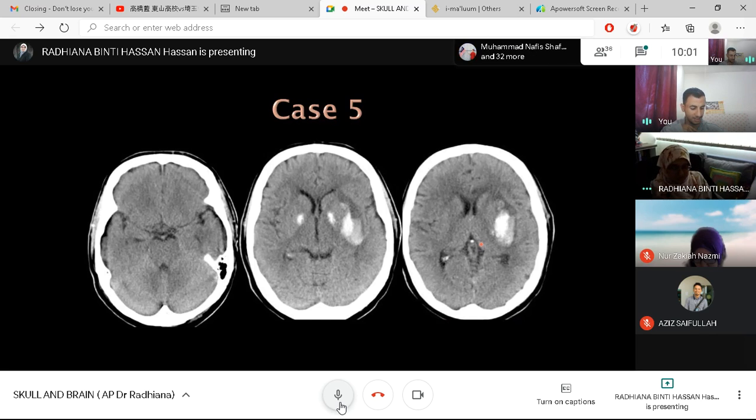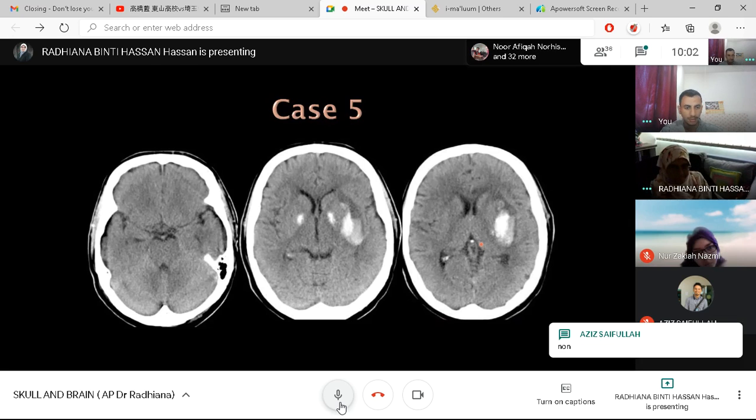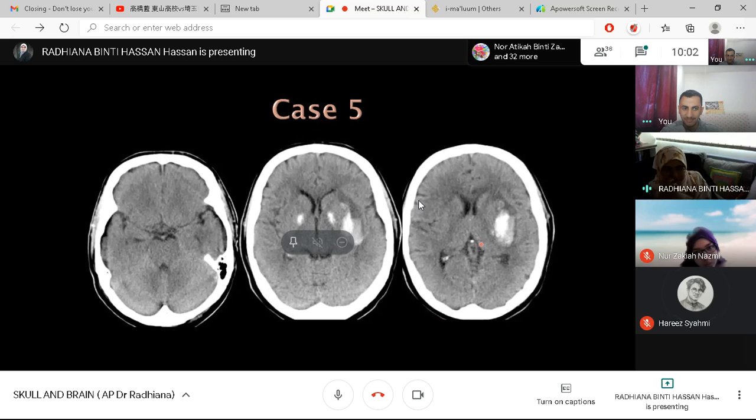Yes, please. Is it contrast or non-contrast? Non-contrast. Why do you say non-contrast? We cannot see any blood vessels.